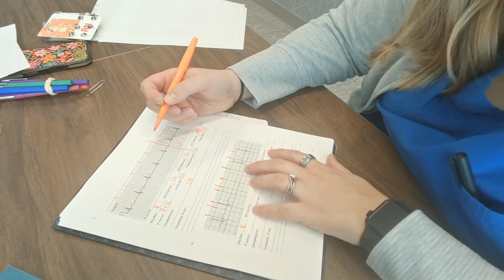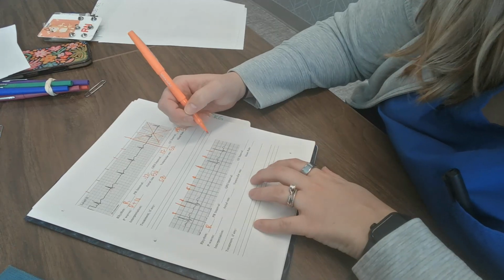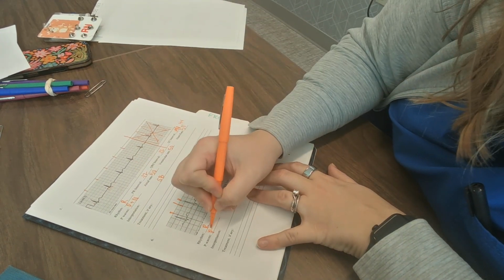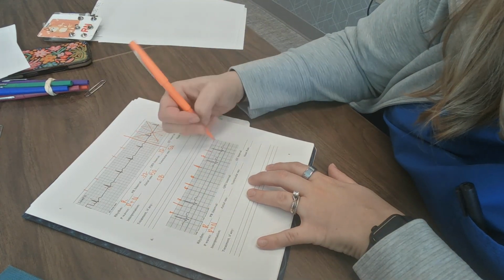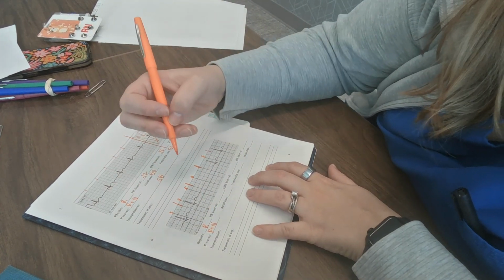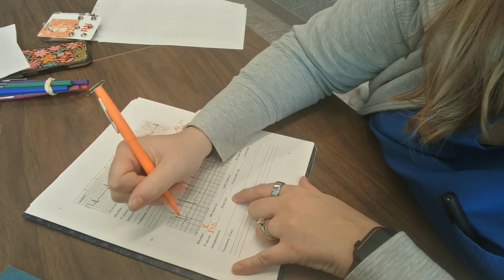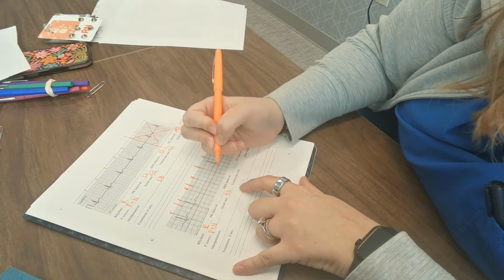This is actually too small of a strip, so that's not a great example either, but we're gonna pretend it's 6 seconds, okay? My P waves are present and they're normal. Again, this is not even a full 6-second strip, so we're just gonna pretend that it is, for the sake of time. I need to go back and fix this. So the atrial rate, the P waves, 1, 2, 3, 4. I'm gonna say that's 40.